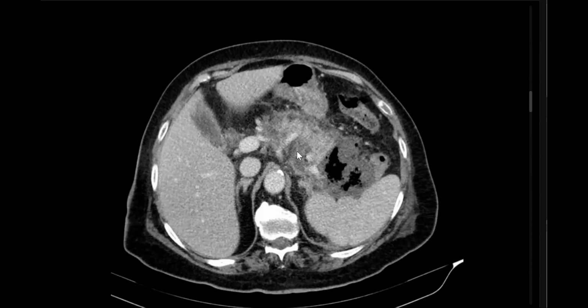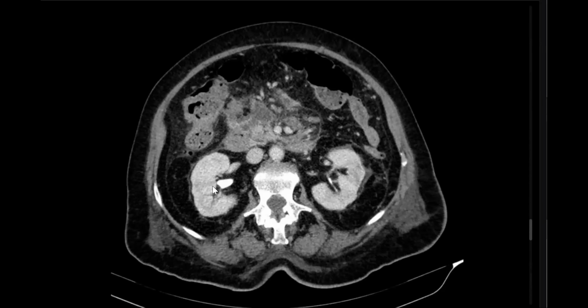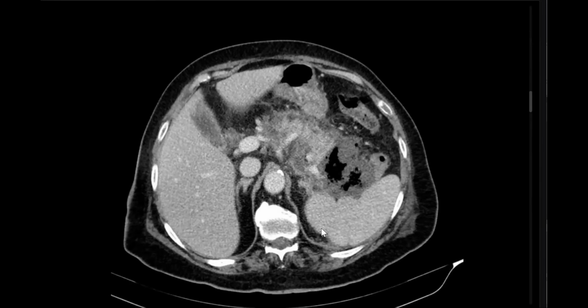And also to rule out the complications: no venous thrombosis, no pseudoaneurysm formation, and no shock syndrome. Okay. Yes. Normal enhancement of the kidney, adrenal, and bowel. Mild effusion. Very good, my friend. Well done. Management, just to finalize the case. Yes, I will convey my findings to the referring physician and recommend the patient for surgical consultation because it is an emergency. Very good.